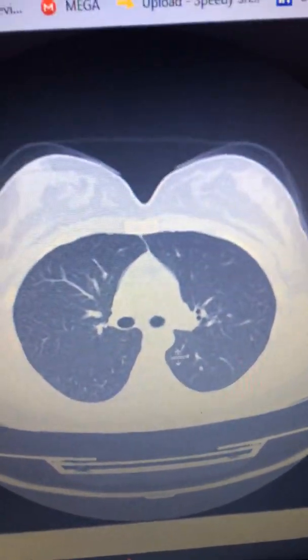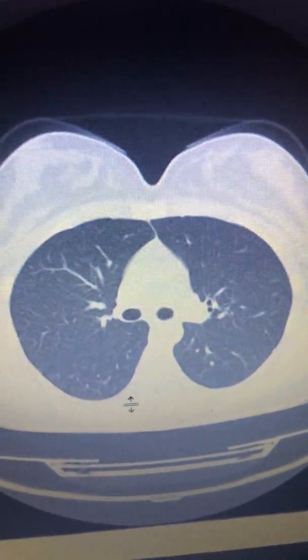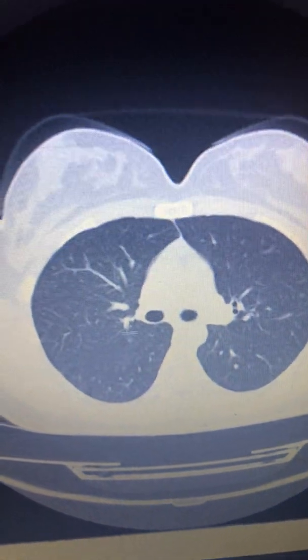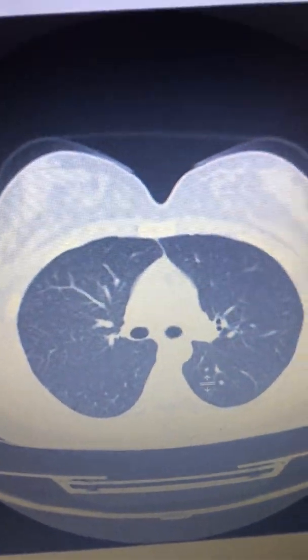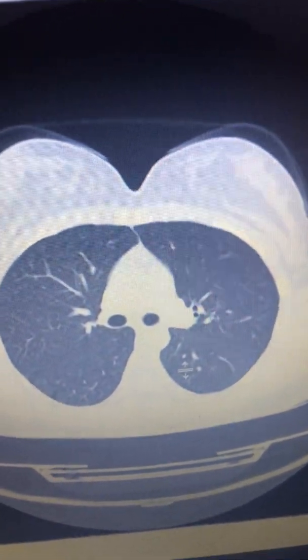As we go on, we have taken so many slices here, and after taking so many slices, we are looking at all the slices, apart from each other by 1 centimeter or something. Okay.